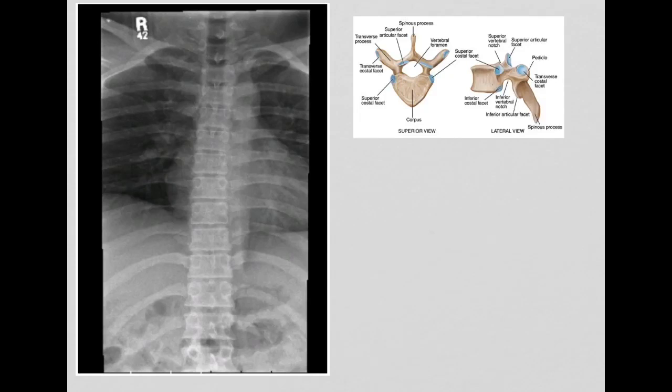Welcome to your first online tutorial for image critique. Today we're going to be looking at an AP thoracic projection as well as a lateral thoracic projection. We're going to jump right in and get started without any hesitation because I know you people are busy.